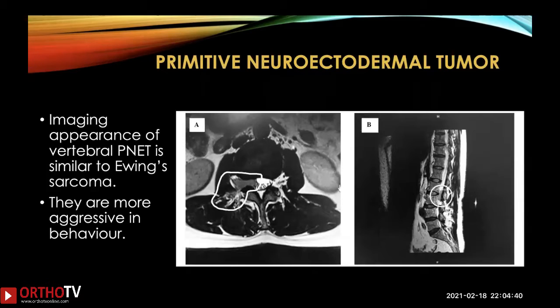PNET is very rarely seen, but it can be seen mostly in the lumbar area. If you follow them up for a month or 2 months, you can see that it eats up the whole body as well as the vertebral arch.